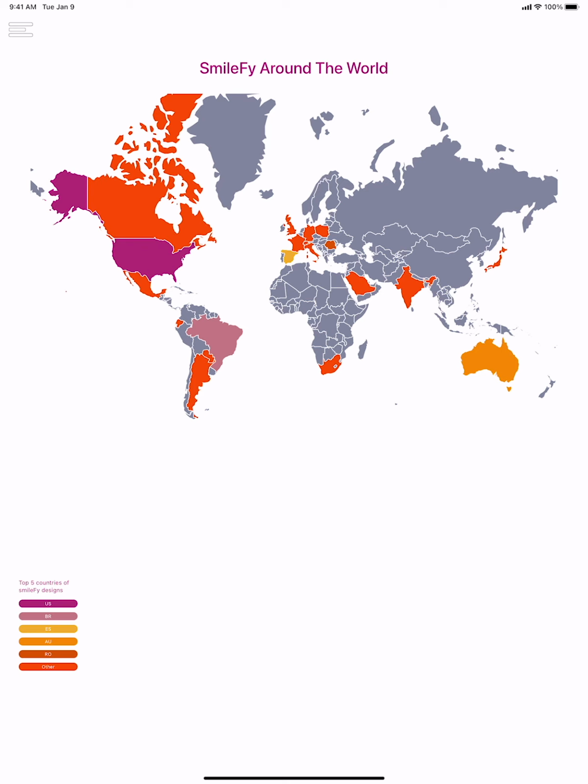What does guided workflows mean? We have more and more features and more complex workflows, but our goal is to make it simple for everyone. For example, if you want to design a motivational mockup, you can follow certain steps, ignoring all other features. That way you speed up and optimize the design process.